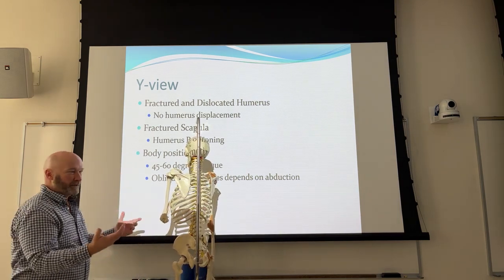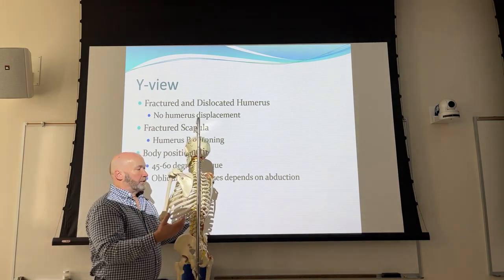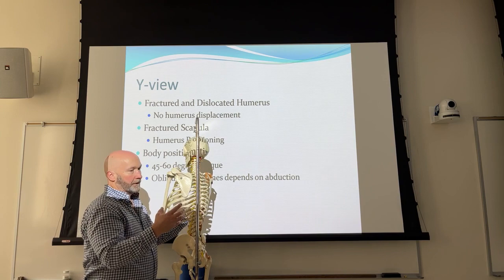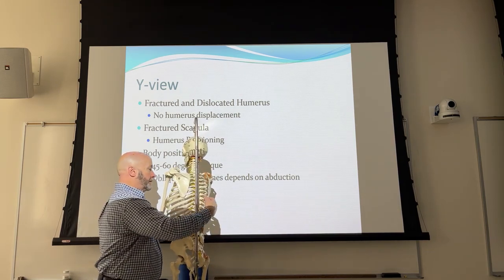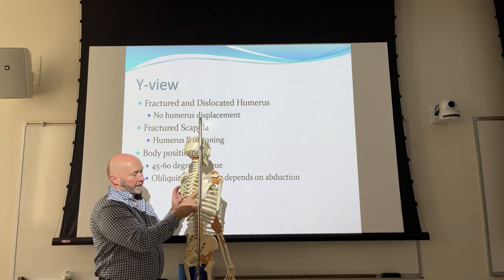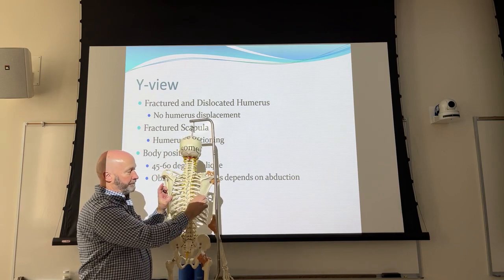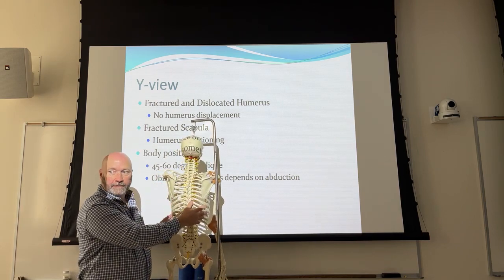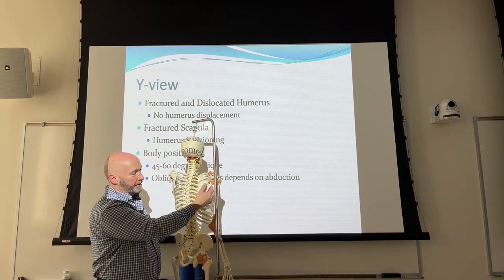So they're the same. But you can also evaluate your degree of obliquity, whether you're oblique enough versus not enough, by looking at the two different borders. The vertebral border, the medial border of the scapula, is very thin, right? It's just a pencil-fine line in appearance on the image.